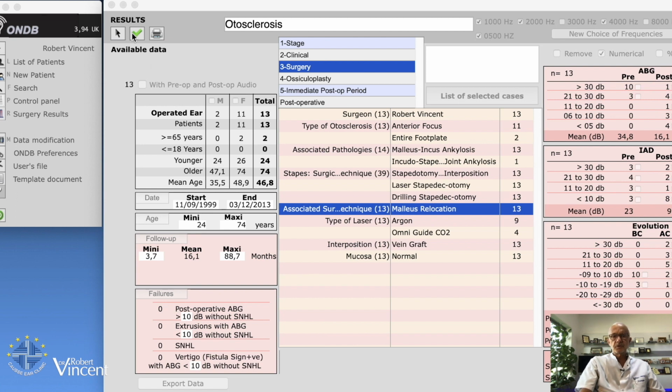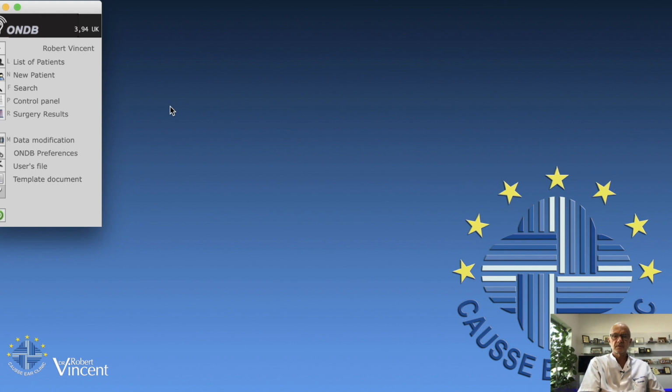So that was the first part of a demo talking about otosclerosis primary surgery. I hope you enjoyed it. We will go separately for another demo now with revision otosclerosis, and then I will show you how to use it for ossiculoplasty another time, and then other parts will be demonstrated on how to use the program, if you want to change things, if you want to enter a new patient, how to enter audiometry, et cetera. But this will be made separately in different parts.